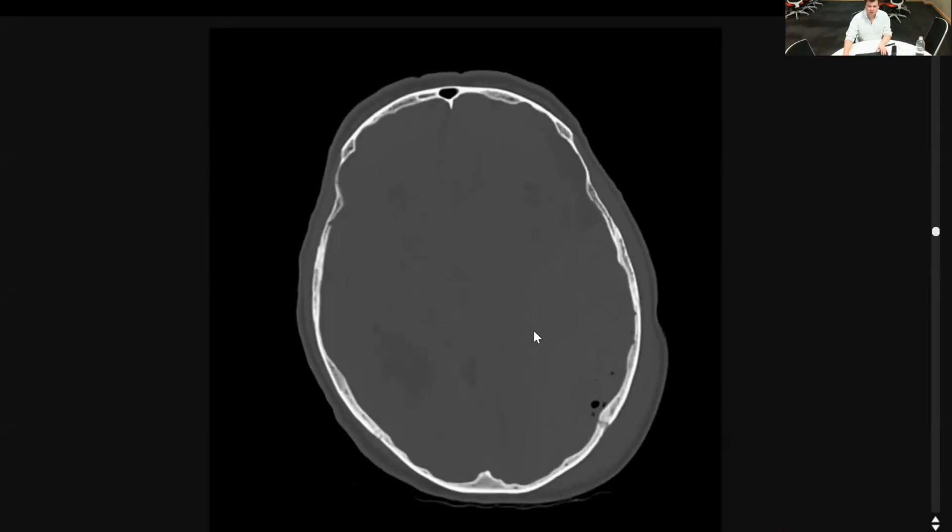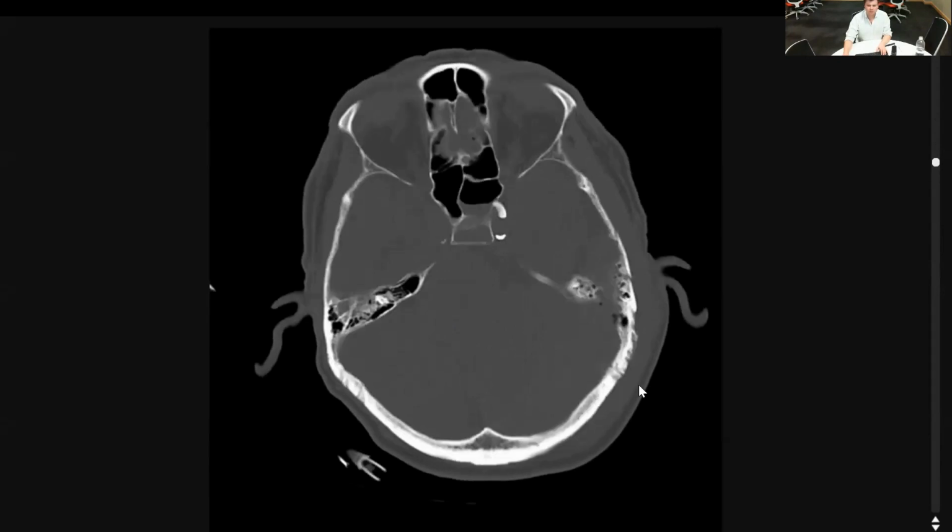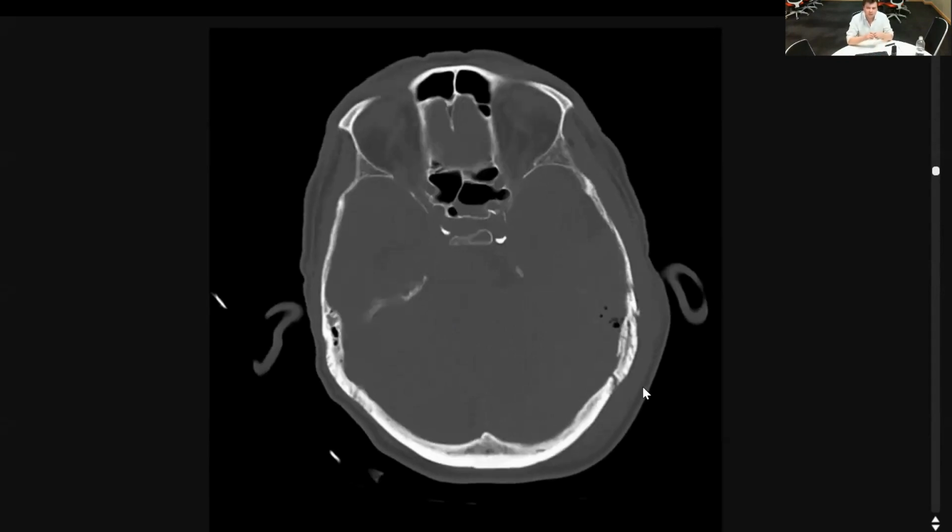If we look on this patient as well, what's the other concerning thing anyone can shout out here? What's something I would want to be seen in the conclusion of this report? It's gas. Yeah, so we've got gas inside the head. So what does that mean the clinical team have to be doing? So like a basal skull fracture, so infection.